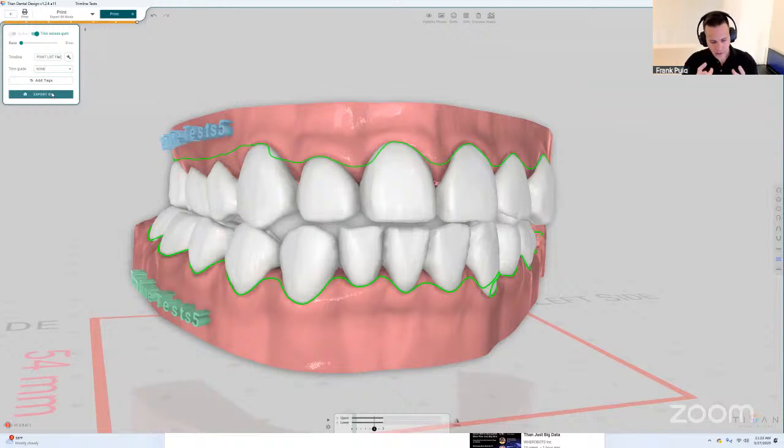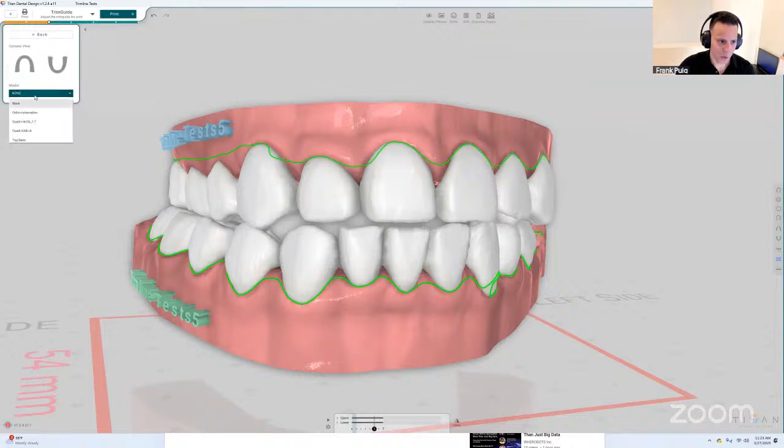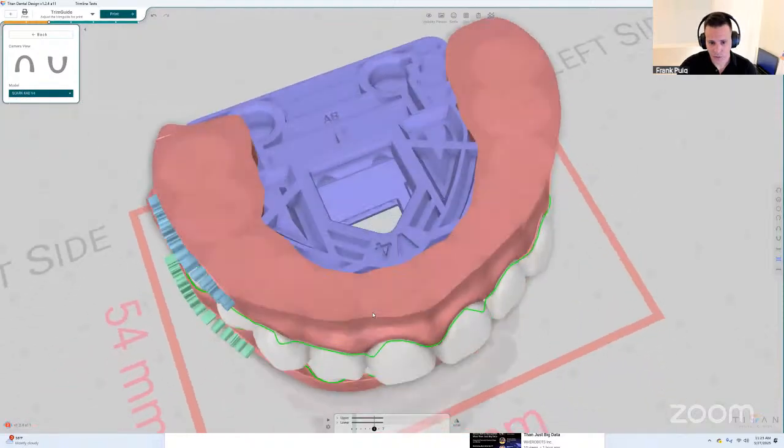So, it needs to know where in the space the model is located so that it can match it to the trim line. So for this, you have the trim guide. And we currently support a few trimmers that have their guides and models, and you can upload your custom model. But we improved this a little bit. So now, if you're using a trimmer, you can also place labels on those. Let's say that I'm gonna do this one.